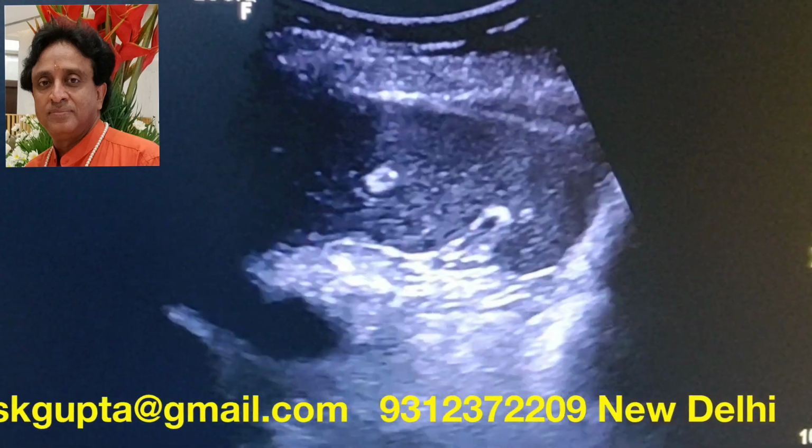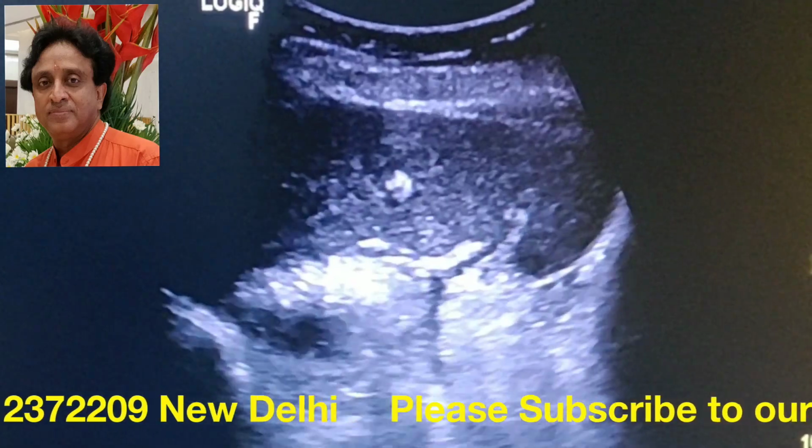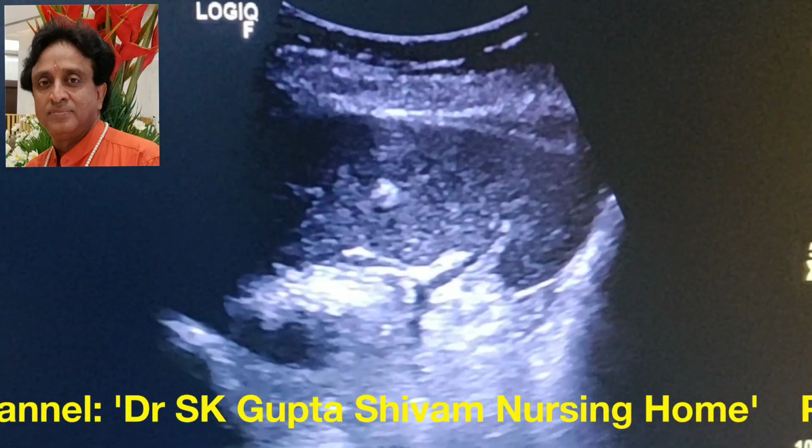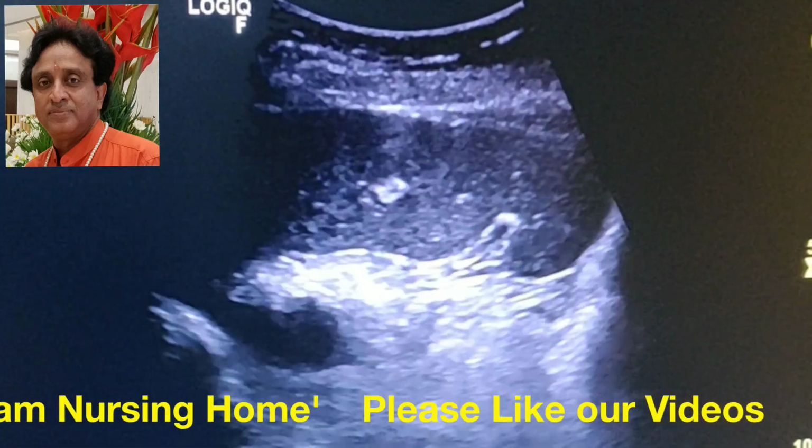And whenever you find calcification in the spleen, whether it is isolated or it is multiple punctate calcification, as we saw in the earlier case, it should be reported accordingly.